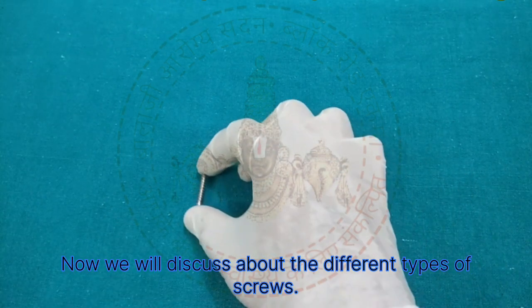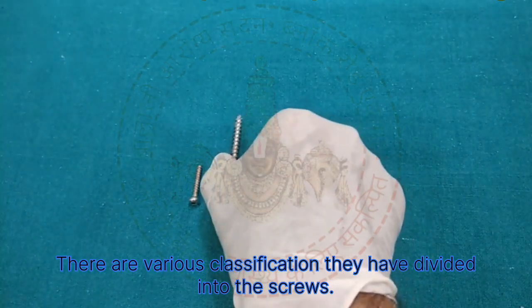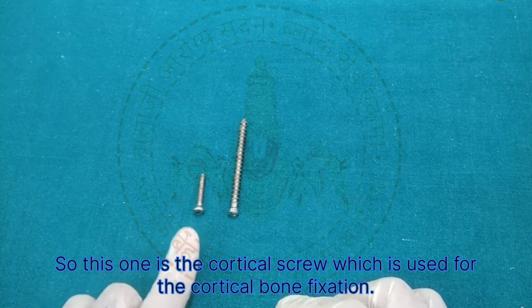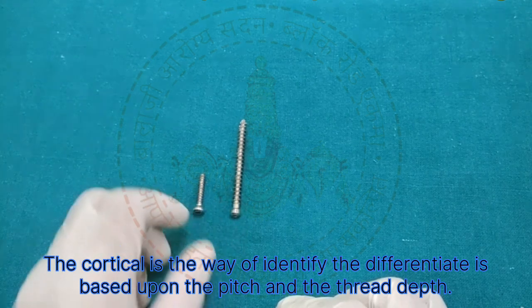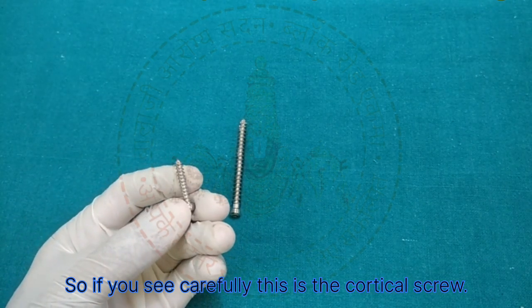Now we will discuss the different types of screws. There are various classifications into which the screws have been divided. One is the cortical and the cancellous. So this one is the cortical screw, which is used for cortical bone fixation. This one is the cancellous screw, which is used for cancellous bone fixation. The way to differentiate them is based upon the pitch and the thread depth.